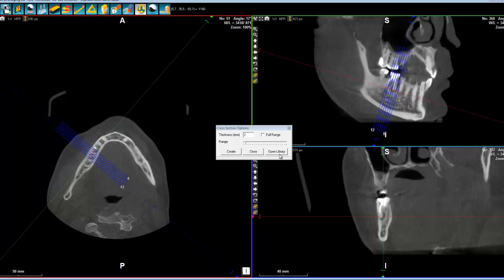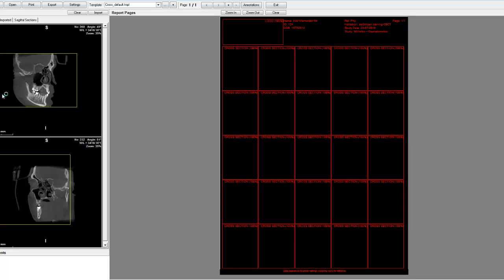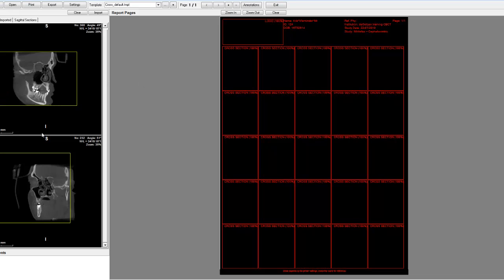I could go directly to the library, but I wanted to show you how you could reach it. You could reach it like this. So simply on the last one, because it's supposed to be the last one that you do before closing a case. And then the space is divided in two. You've got here your images that you've been storing during your diagnostic.